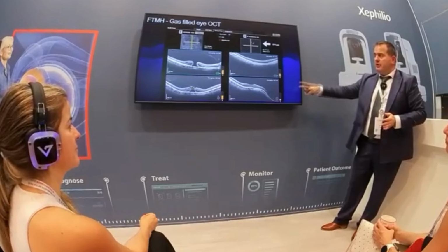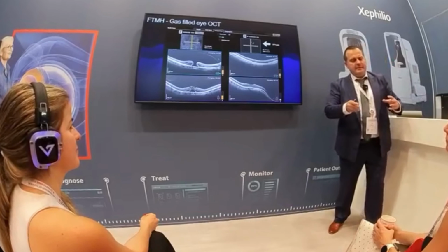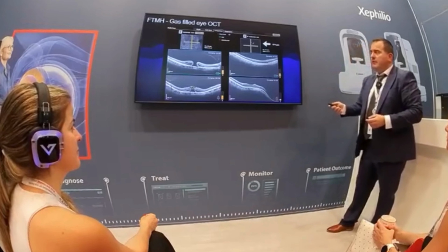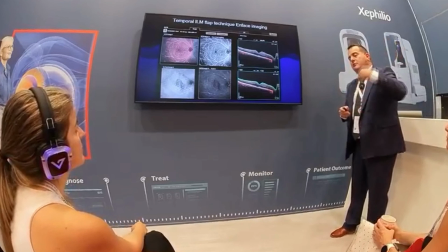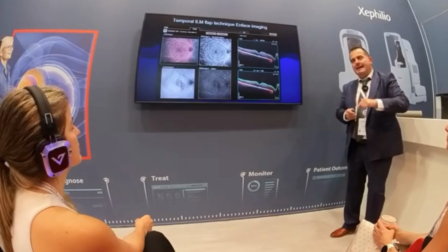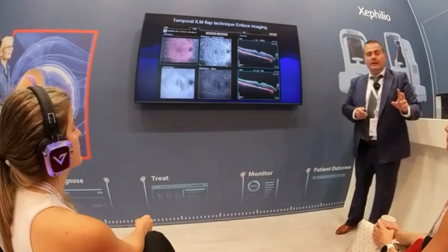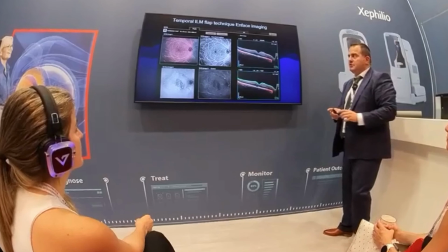The first time I got this, I thought, okay, it's luck, something that luckily coincides in a good image. But then what happened? We had additional ones, and we continuously started to implement in our workflow first-day post-operative OCT in gas-filled eyes with Canon. Of course, this cannot happen automatically. I will explain later how it can be achieved.